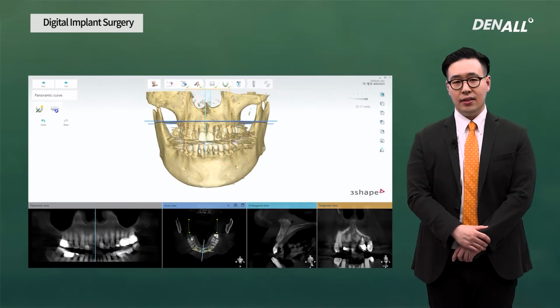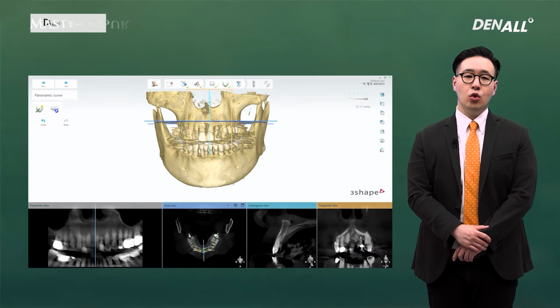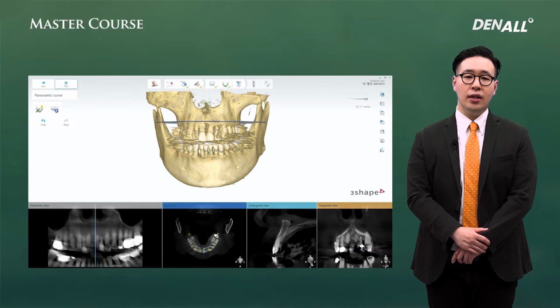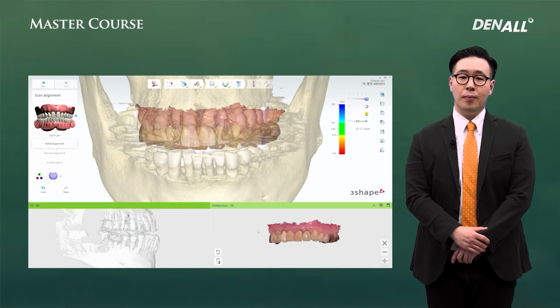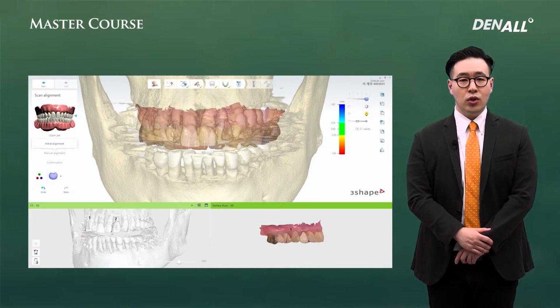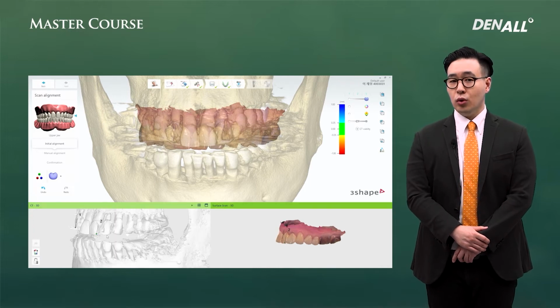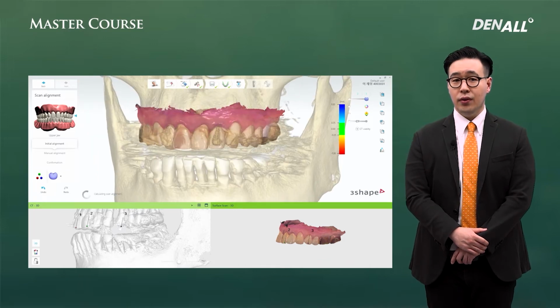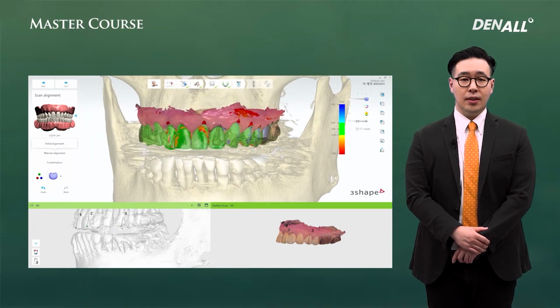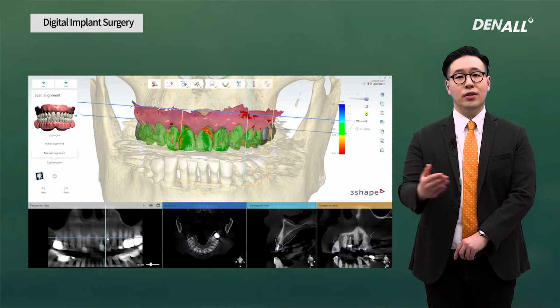On the surface scan, the tooth is reduced or deleted. On CBCT, the occlusal plane is aligned. And then CBCT data and surface scan data are merged. Automatic merge is very efficient these days and very accurate. However, sometimes automatic merge can fail. In that case, 3 points need to be decided. As you can see, that will increase the accuracy of merging.